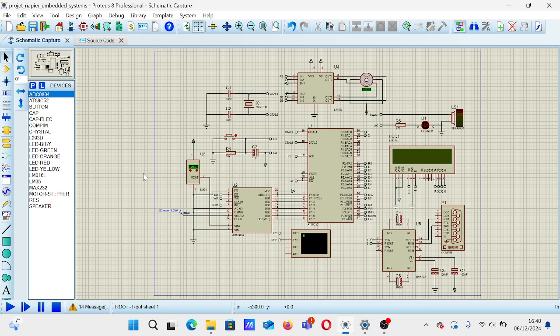First of all, the Atmel AT89C52 microcontroller, as you can see, is used as the central component of the air warming medical device. This microcontroller is completed by an oscillator and a reset circuit block, with crystal, capacitor, resistor, and electrolytic capacitor components. Then, for the other components, there is the LM35 temperature sensor and analog to digital converter, as you can see.